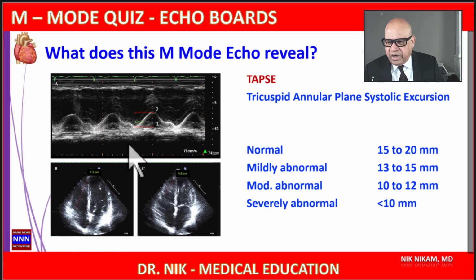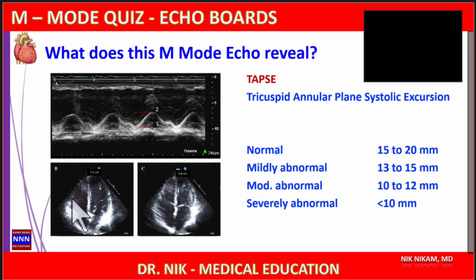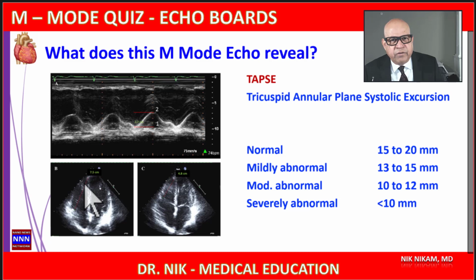systole. On the right side, it is measured by seeing how well this tricuspid annulus moves during right ventricular systole, which is an indirect reflection of the right ventricular function. The more vigorous the movement, the better the right ventricular function. The less the tricuspid annulus movement, the more it represents reduced right ventricular function, especially when it's combined with an increase in right ventricular dimension.